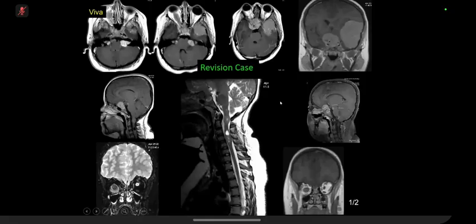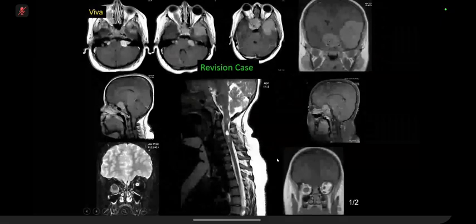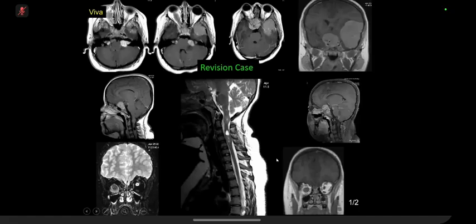Looking at the cervical spine on the T2-weighted image, I can see multiple lesions which are causing cord expansion and have high signal within, as well as heterogeneous low signal. I think the constellation of findings are bilateral schwannomas and optic nerve meningioma and spinal ependymoma, as well as intracranial ependymomas. The most likely diagnosis in this case would be NF2.